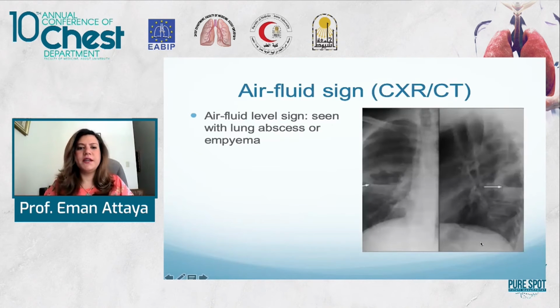Air fluid sign, you can see that with lung abscess or empyema on a CT or a chest x-ray. We have this cavity, and then we have this air fluid level. So that's the air fluid sign.